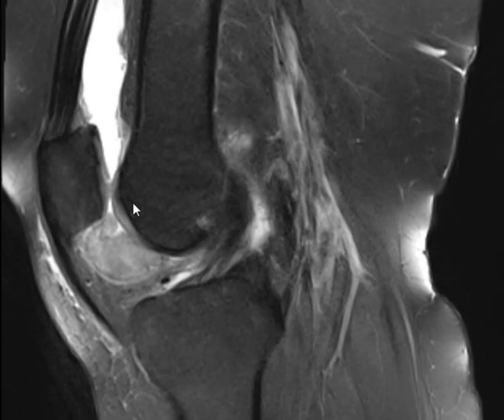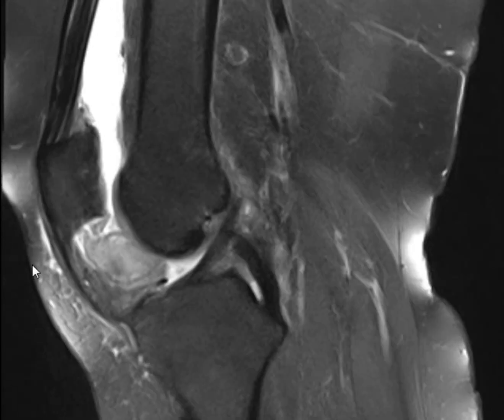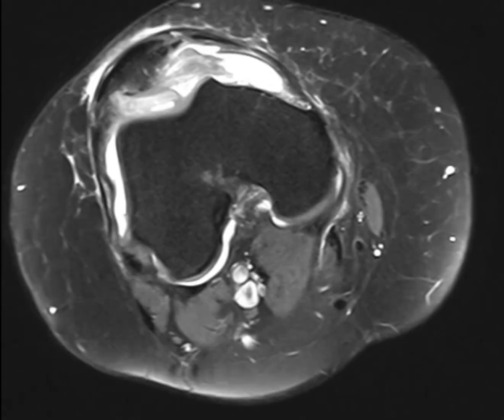it's not suppressed and it's hyper. Well defined or ill defined? Almost well defined. Let's see it on the axial images. Probably we can have a better look.